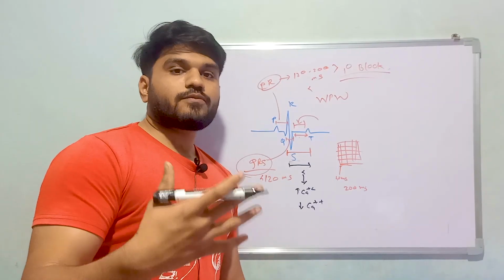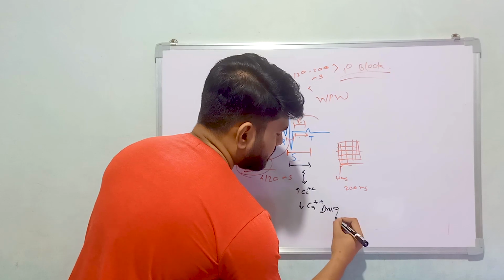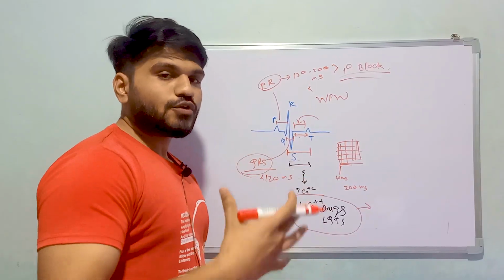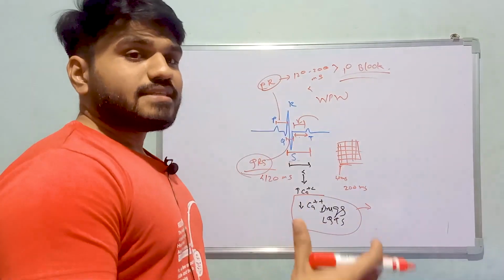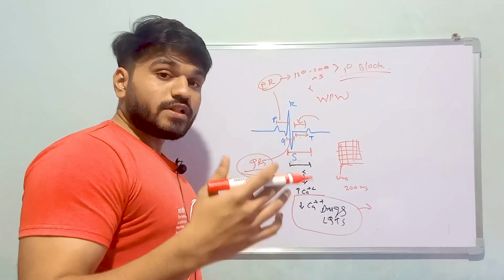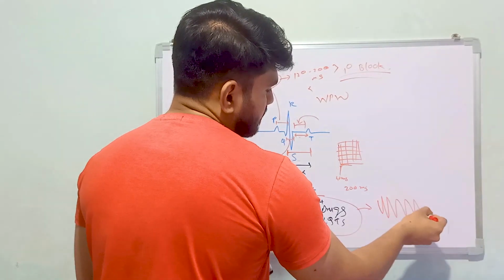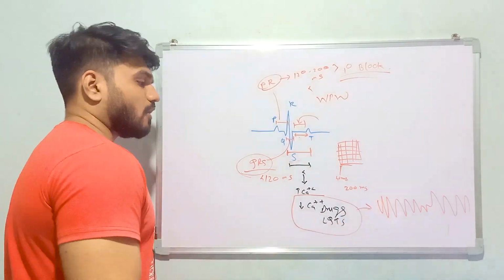Okay? And other causes of prolonged QT interval are drugs and long QT syndrome, congenital long QT syndrome. One feared outcome of prolonged QT interval is torsades de pointes. And this is the most feared outcome. Why is it the most feared outcome? Because if you see the ECG, you yourself will get scared. You will see the ECG looking like this.